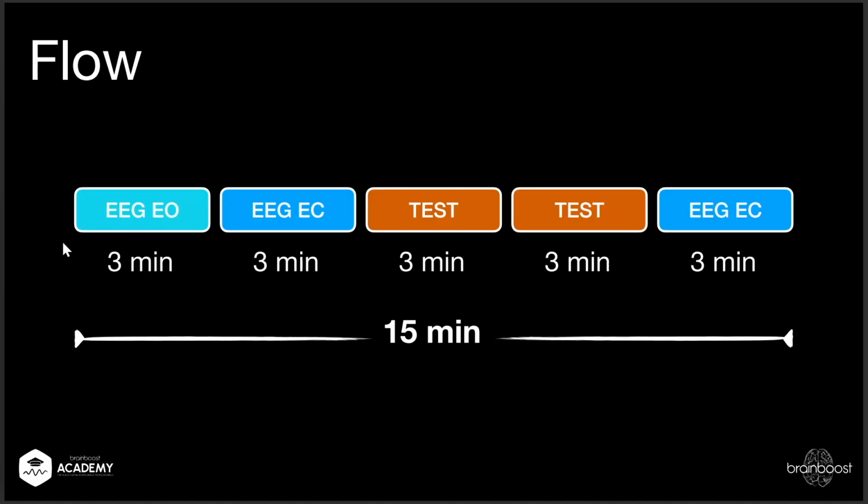Last time I gave you an example flow, where you can see what you need is an Xbox controller that you connect with your computer. So I have one here. Usually they're black or white. This is a blue one. And you hand it over to your client. You start a recording. I will go over this today.